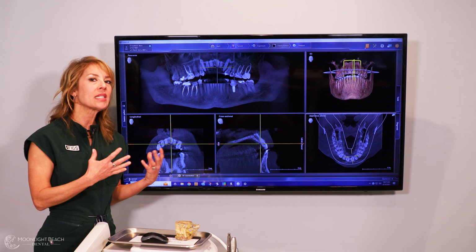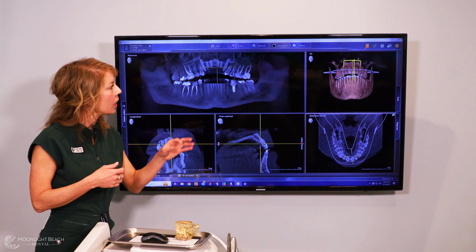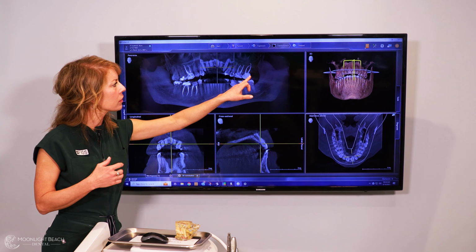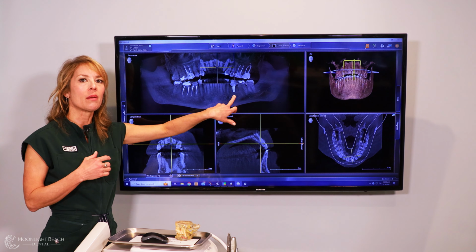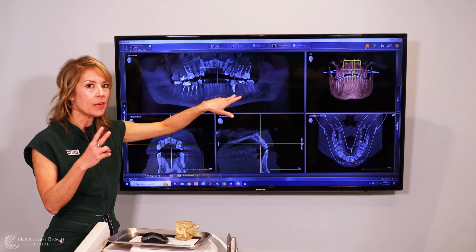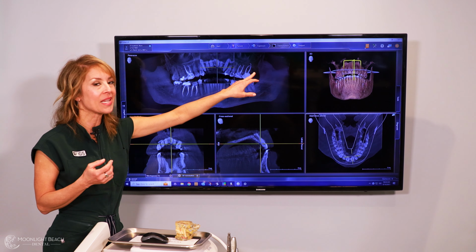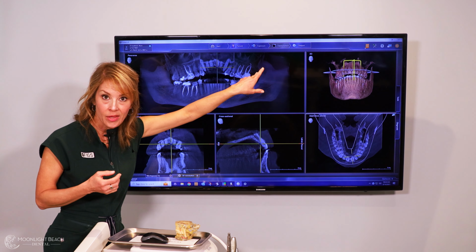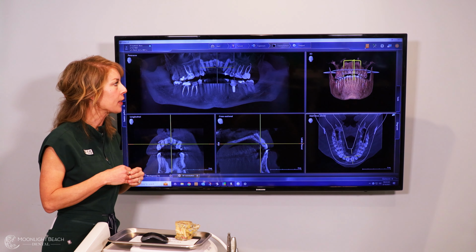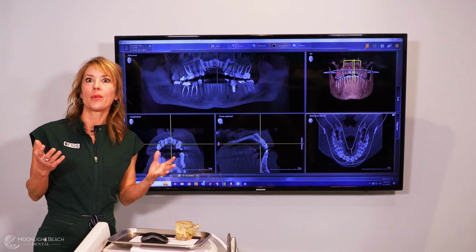And what I like to see first when I glance at these x-rays is that this patient has had multiple root canals, and this implant was done because a root canal was redone twice and then the tooth needed to be extracted. And then when I asked why this wisdom tooth was missing, even the wisdom tooth had had 2 root canals and then cracked and needed to be extracted. So my first thought when I saw this is, wow, that's a lot of root canals.